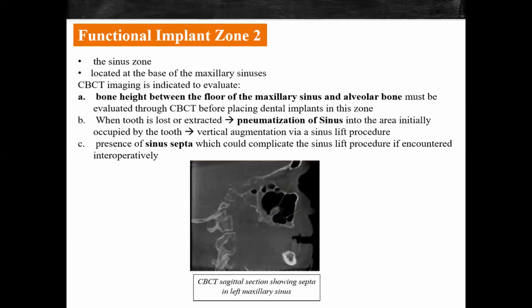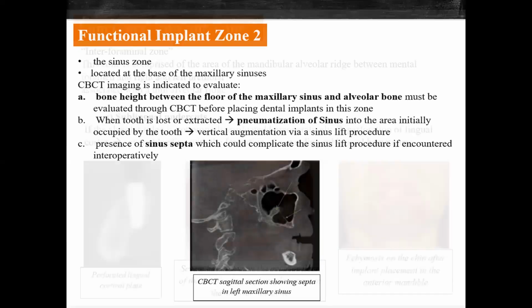Now, there is a vital structure called the pterygopalatine fossa. This fossa has many vital structures. The greater palatine vessels also pass through it. So in case we hamper that fossa, there are chances of profuse bleeding. So you need to understand and visualize this anatomy, because based on the anatomy you will change the inclination of your implant.